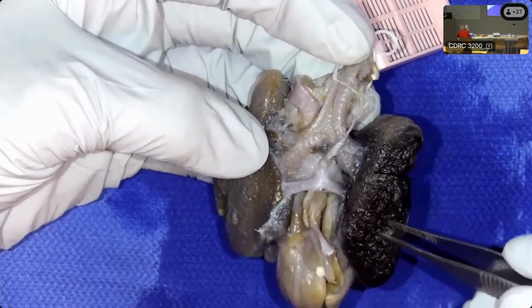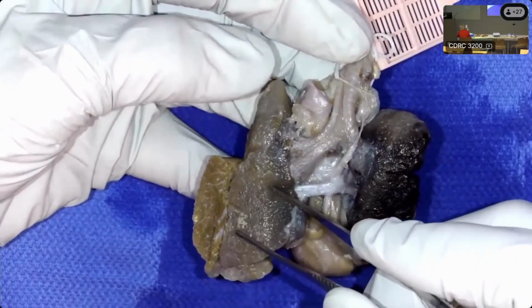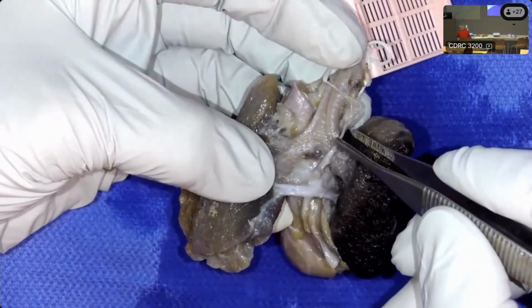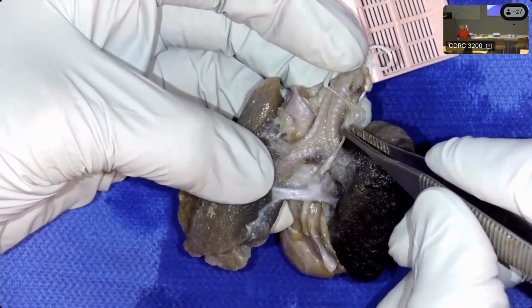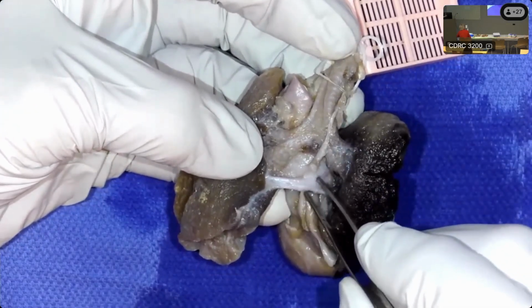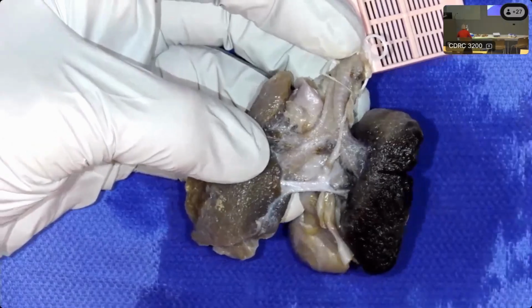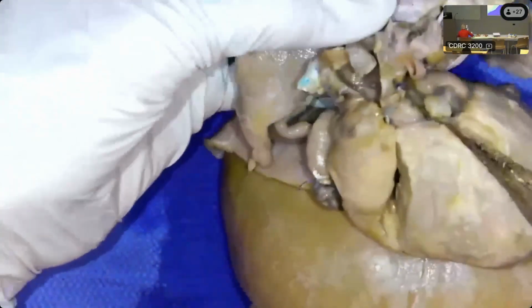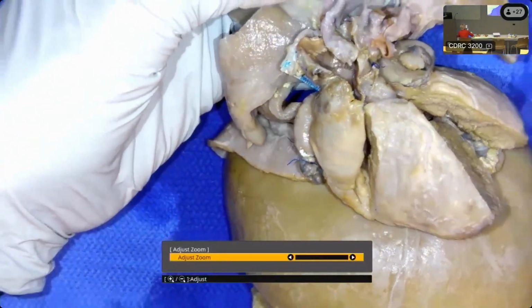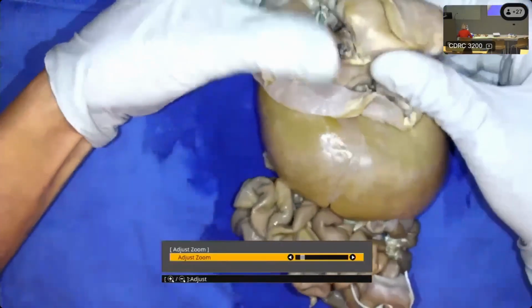You can see all these nodular areas on the lungs. So there's pulmonary lymphangiectasia and severe pulmonary venous stenosis with this tiny vertical vein draining the pulmonary confluence behind the heart. So in this next case, I have all of the organs attached, and the heart is quite interesting. It's been repaired, but we can still see the initial anatomy.